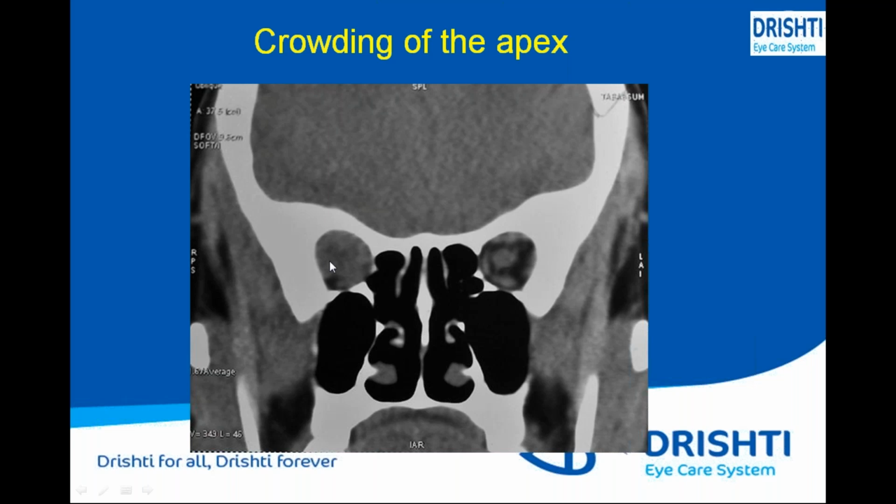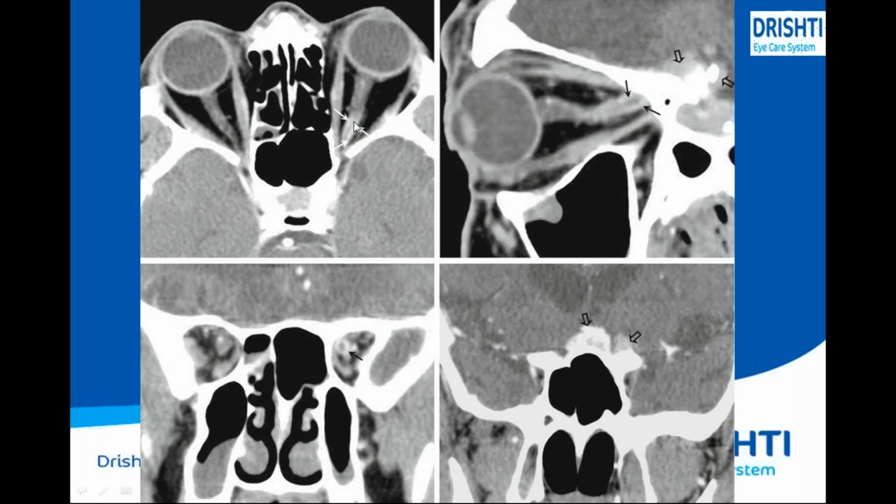Now this is the fourth image. The first one is the fusiform of the optic nerve. Fusiform meaning tapering from both sides. Both sides are tapered, this and this are narrowing. So this is called the fusiform of the optic nerve.